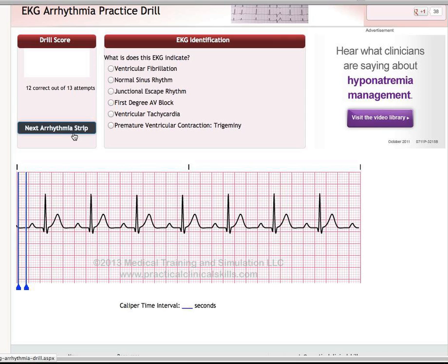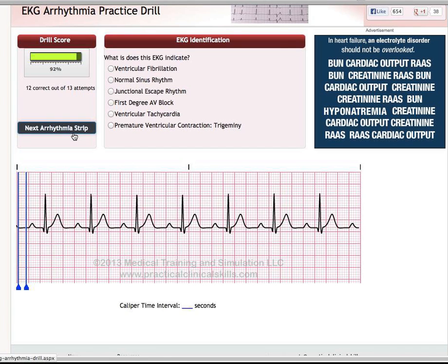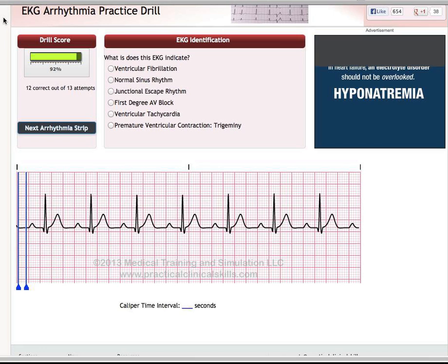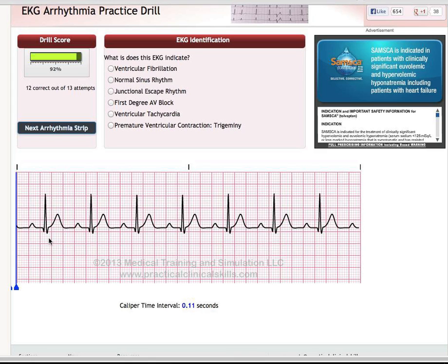All right, what is going on here? Let's take a look. So, what do you guys see in this patient? First, is the rhythm regular or irregular? I think this rhythm looks to be pretty regular. How about the rate? Let's check a rate. We kind of have to fudge it. It's between the two boxes. So let's go 300, 150, 100, 75. So rate is normal. It's not tachycardic. Right around 75. We have P waves. Yep, P wave for every QRS. That looks good. The QRS complexes look to be thin. That's healthy. So let's look at our PR interval here.